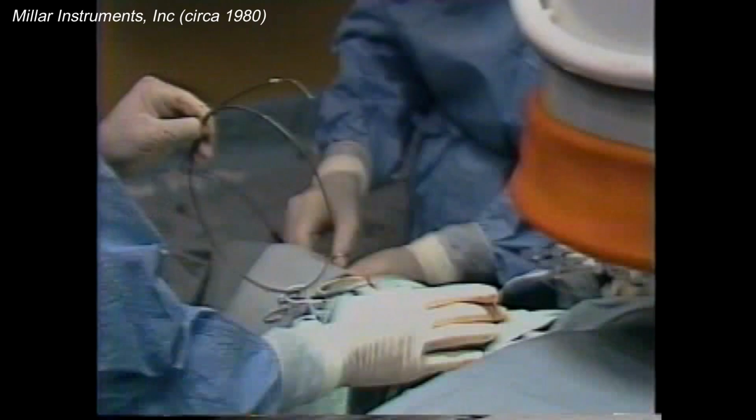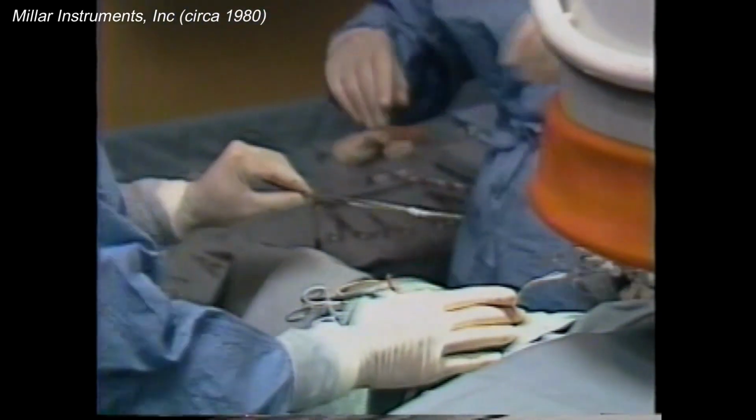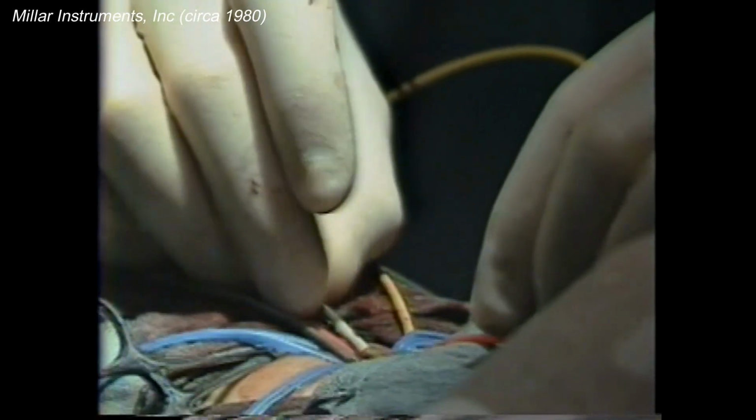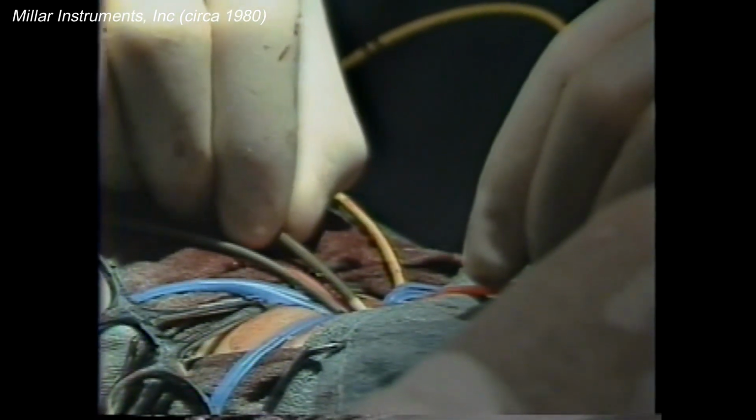We feel that the best test for a pressure measurement system is its ability to produce consistently accurate pressure measurements. When you use our catheter-tip pressure transducers, we feel sure that you'll have a transducer system that will pass this test and give you the accurate results you require time after time.